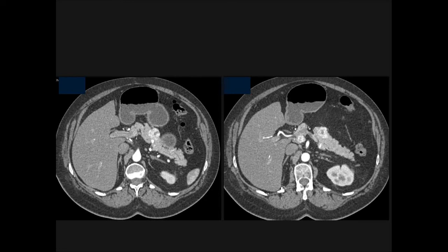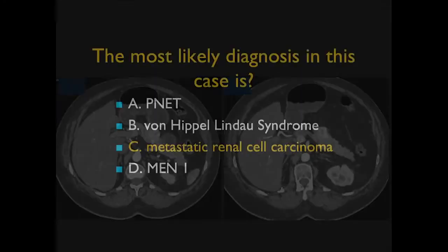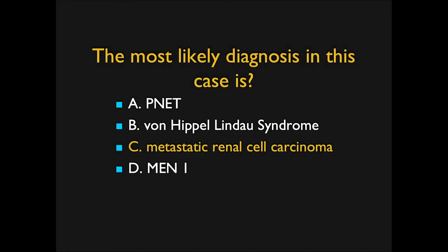some clips present. It's a little subtle, and if I gave you more images, you would see the absent right kidney, which indeed the patient has an absent right kidney. And the patient originally had clear cell, and this is metastatic renal cell carcinoma. It's rare to see Mets at presentation. Usually it's a patient who's been treated well, and it's 10 to 15 years after diagnosis. We are seeing many more metastases to the pancreas as the only site of recurrence. Just a really nice example.